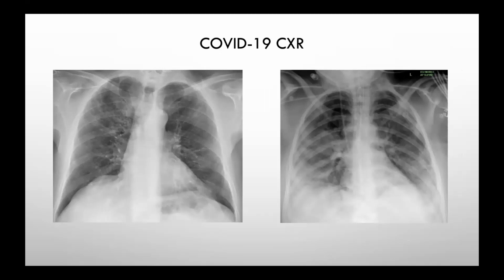And these are two other x-rays of fairly early COVID-related disease. So you can see the first x-ray, it's bilateral change. It's a much more reticular pattern spreading out from the center and outwards. But you can also see in the top third of the lungs that there's coarse reticulation, or lines, that are extending all the way out to the periphery. So that's clearly abnormal. That's not your normal lung markings.